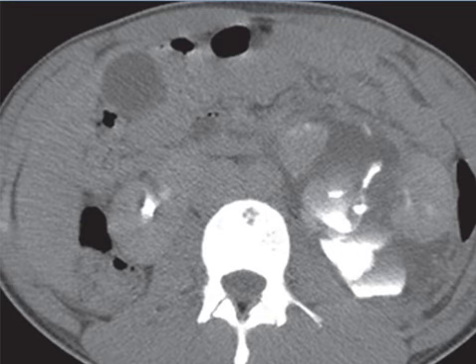So this is the end of presenting the case of the horseshoe kidney with incidental normal finding, and another patient after renal trauma. A question: what is the relation between the isthmus and the inferior mesenteric artery?